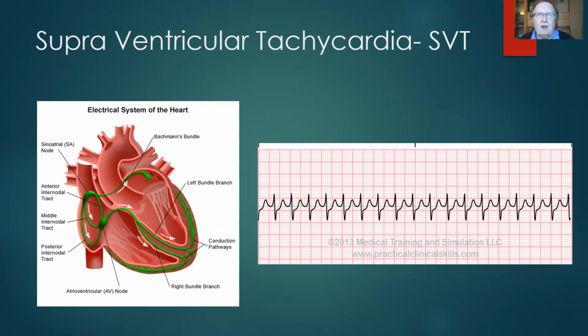And I thought, well, you're not going to grab that out of the sky. Popped him onto the stretcher, wired him up on the heart monitor, and there, right before our very eyes, is supraventricular tachycardia. So don't get caught out. Supra means above. So now when we look at this rhythm, it's fast, so it's a tachycardia. It's regular, so that's a good thing. But there are no discernible P waves.